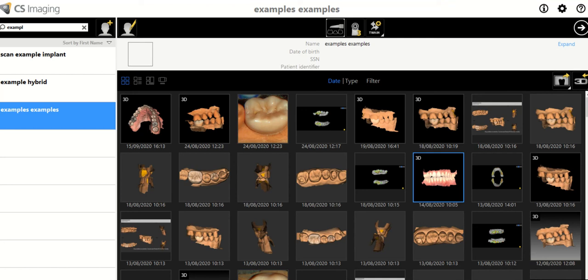So once you've taken your intraoral scan using either the CS3600 or the CS3700 Carestream Dental Intraoral scanners, how do you send it to Patterson Dental?